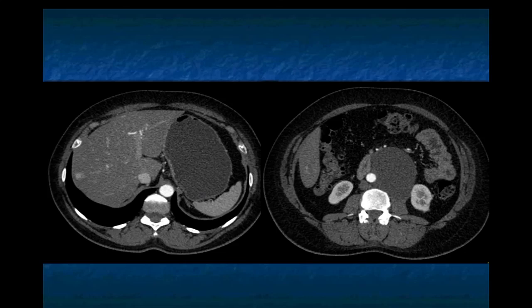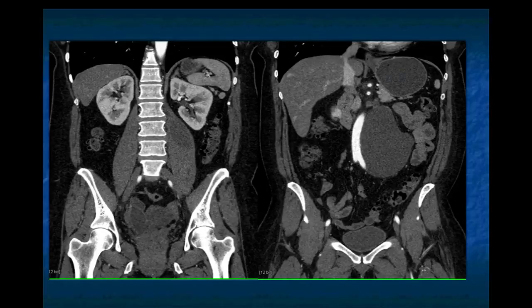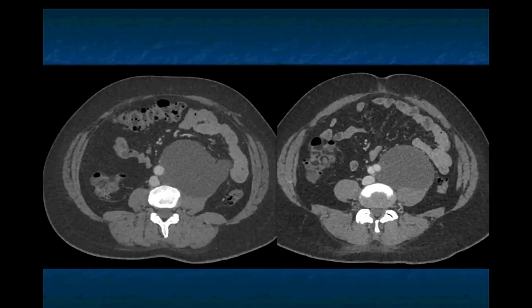But what about the cystic lesion pushing on the aorta and left kidney? What is that? It's water density. You can see it pushes on the aorta. If the patient had surgery, lymphocele or seroma would be possibilities, but the patient had no surgery. It's well-defined water density. Typical things you think about: lymphangioma. I guess you could consider an old hematoma, but that would be unlikely. It's so nice and homogeneous.